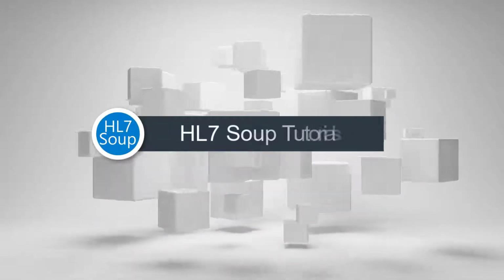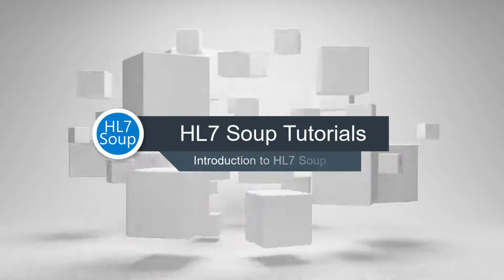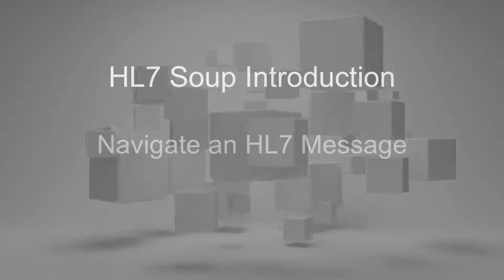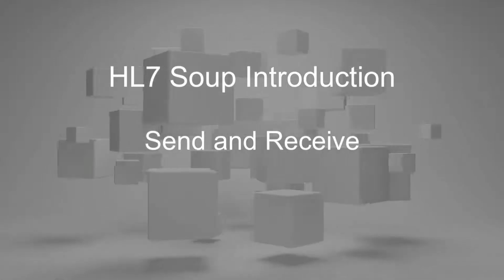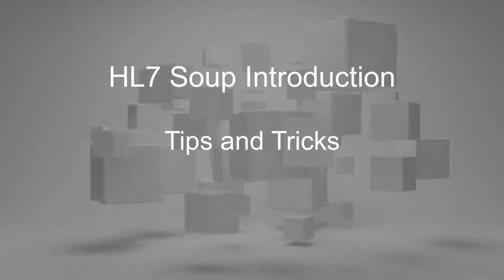Welcome to the introduction to HL7 Soup. In this tutorial we'll show you why HL7 Soup is the world's favourite HL7 tooling. Simple to use yet powerful in function. We'll show you the basics, we'll show you some clever tricks, and point you in the right direction to go further. HL7 Soup is made of two products.